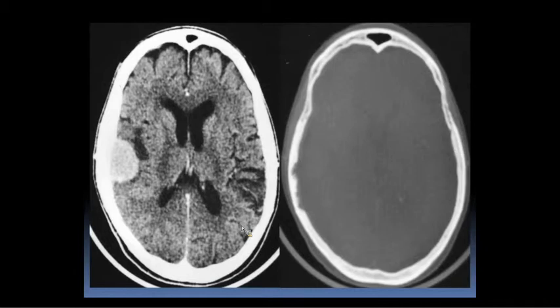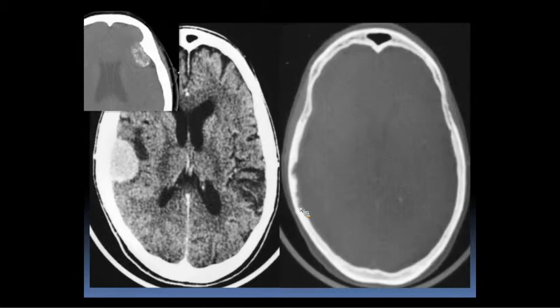So meningioma is definitely the most common, but as I mentioned before, it usually has hyperostosis, so it has bony thickening adjacent to it. And this actually has erosion of the bone. You can see the bone looks ratty, it's kind of eaten away. So this is much less common to happen with a meningioma. And so we'd be worried about something like a dural metastasis, and that's what this was.